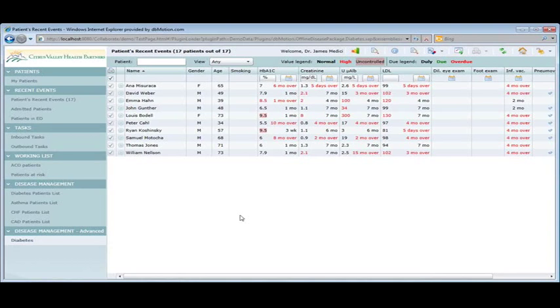Now, since you have all the clinical data contained in DB Motion, go out and fetch all the stuff that I need to see for diabetes, like that clinical view that you saw earlier based on the ontology, and now show me what's in range, out of range, what's overdue, et cetera. So the ability to have an administrator run down a list like this and proactively go out and say, here are the people that are overdue for this, that, or the other thing, or show me the patients that are grossly out of range with their hemoglobin A1C. This is really where we believe is going to be the basis of ACO management.